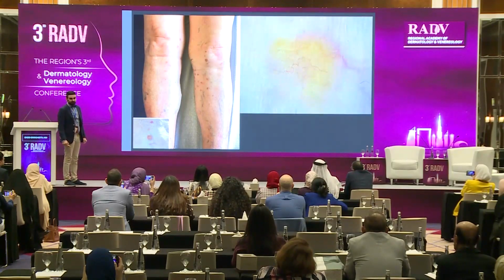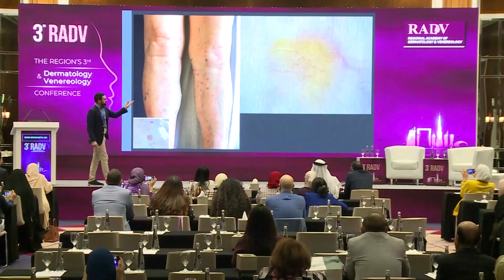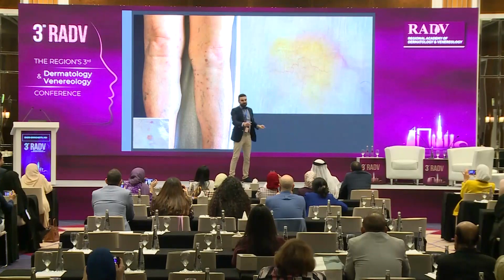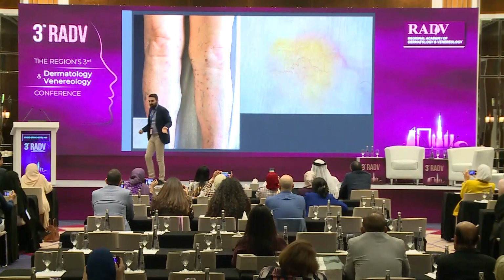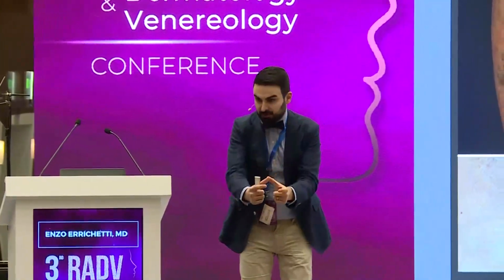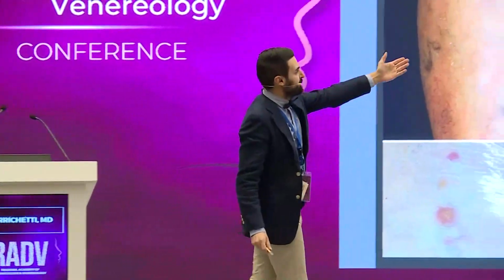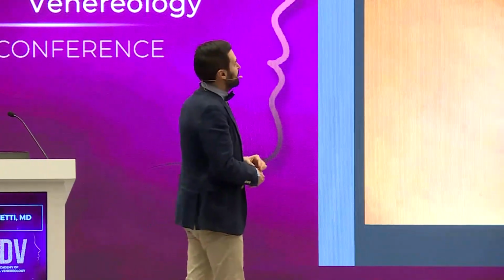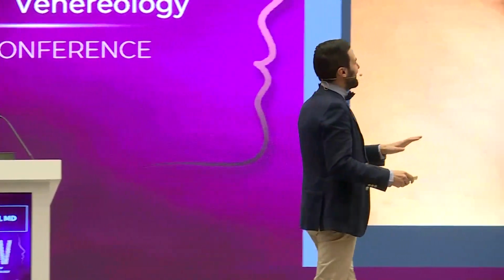Let's take a look at dermoscopy. What is this? We have yellow. We have serpentine branched vessels. This is necrobiosis lipoidica because we are used to seeing the typical plaque in the books, okay? But at the beginning, it may look like this, just small papules. But on dermoscopy, the pattern is the same, so we can recognize it. Perfect. And this, yeah, I agree with you. This time I agree. Sarcoidosis.